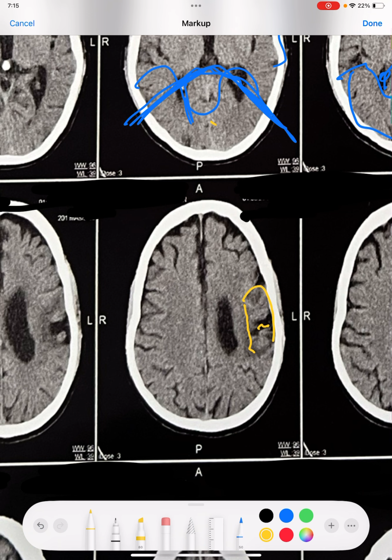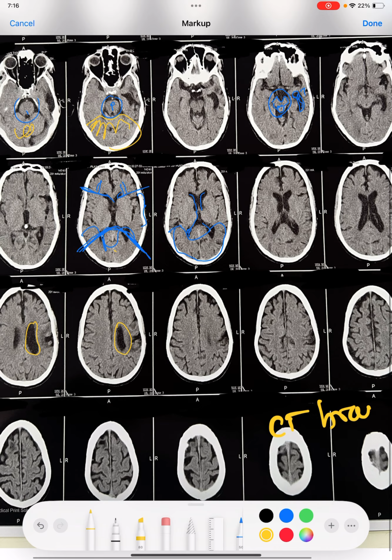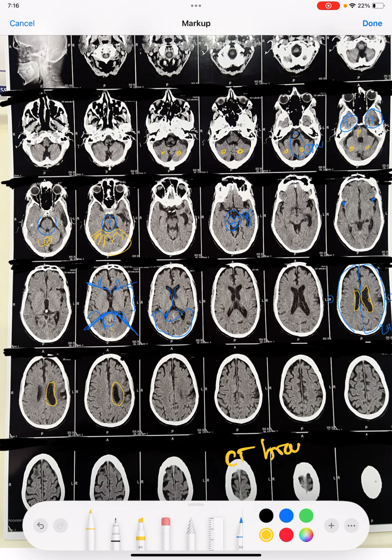There is significant atrophy of the brain parenchyma here, most probably because this is an area of MCA territory. So most probably this patient had a left MCA infarct earlier, which caused significant brain injury and parenchymal loss, which caused secondary dilatation of the left ventricle.